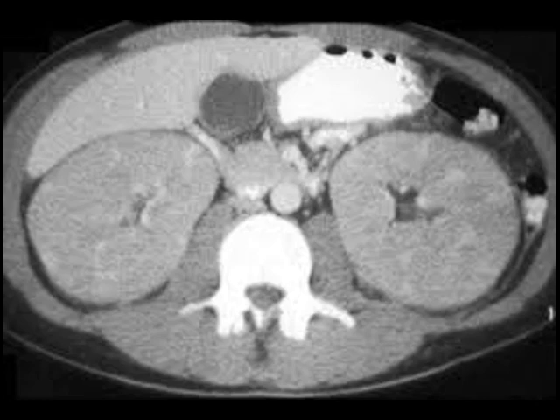What you'll then see on imaging, because it's all being spread through the interstitium, is bilaterally enlarged kidneys with a nicely preserved renal contour. Infiltrative lymphoma is almost always going to be bilateral and patchy, poorly defined. In fact, it's often diagnosed only on post-treatment scans in patients with lymphoma when someone spots that the kidneys are suddenly smaller compared with the initial pre-treatment scan, and they realise that's because the kidneys were initially full of lymphoma.